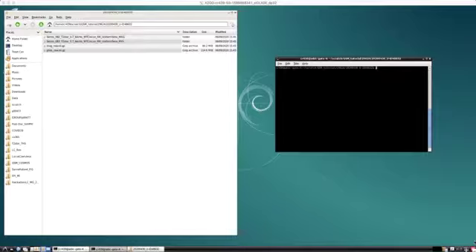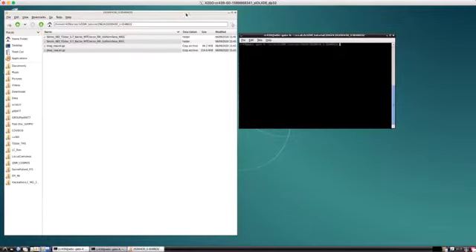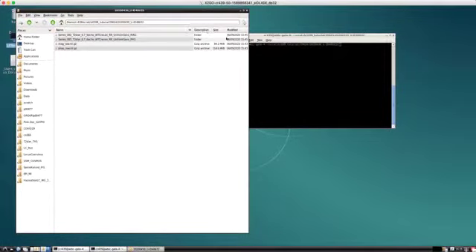Hi, and today I'm going to teach you, this is a tutorial on how to run QSM analysis in order to obtain QSM maps. And I'm going to use data that I've downloaded with the DCM command from HPHI. I'm going to process all the data on HPHI as well.